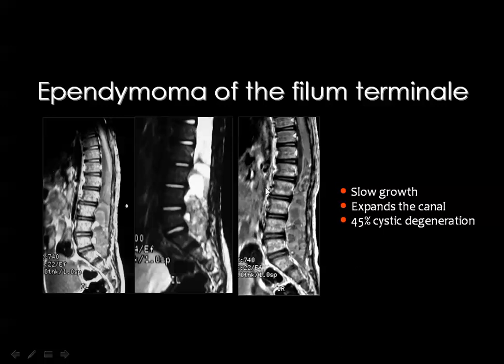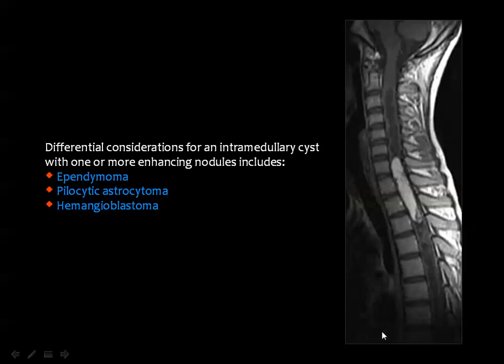And this is also a pediatric example of a filum terminale ependymoma, where the lesion shows some areas of hemorrhage, being of high signal in this T1, and heterogeneous increased signal in the T2 weighted image, and you see this non-uniform pattern of contrast enhancement. The lesion is expanding in the spinal canal, and it may indent the posterior aspect of the vertebral bodies.